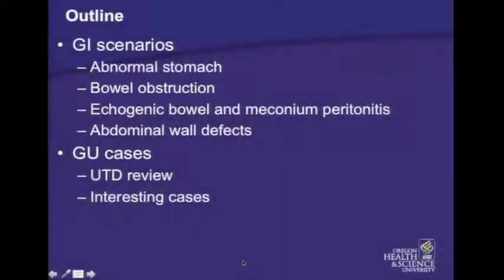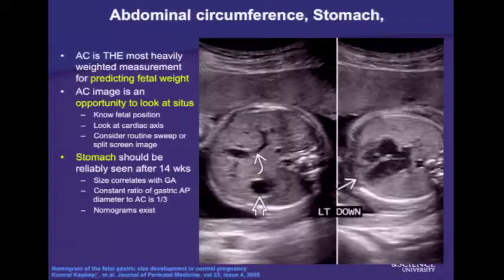My name is Dr. Roya Sohaey, and today we're going to talk about fetal GI and GU anomalies in pregnancy. First, I'm going to go over some of the standard views through the abdomen and pelvis, and then talk about some GI scenarios and GU cases.